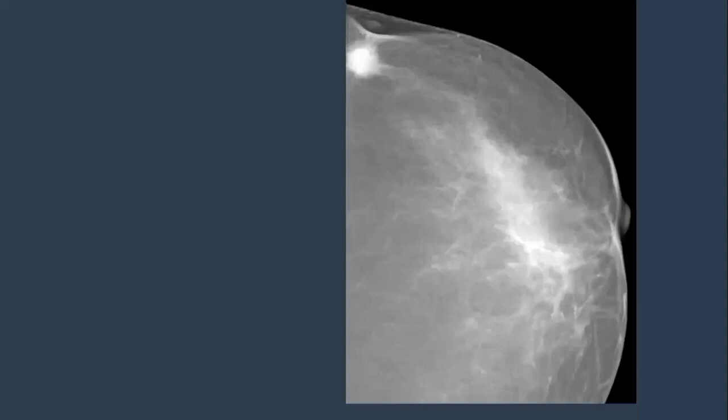About this, these are my patients. So this is an... let us go a little bit quick. Spiculated mass. Excellent, well done.